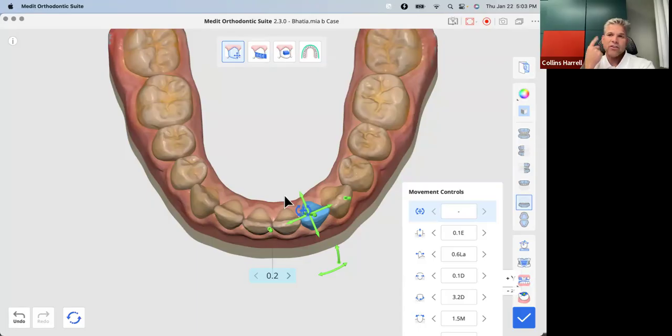So that didn't really answer your question, Dr. Gayatri, about how do I stage at what point the teeth move. That's a more advanced tool that they are developing, and you'll have that at some point probably this next year. Currently, we have to kind of go with whatever the auto staging is coming up with, but I have the option to change the speed, and I can decide how many aligners I want to order. I don't have to order every single stage that's showing.